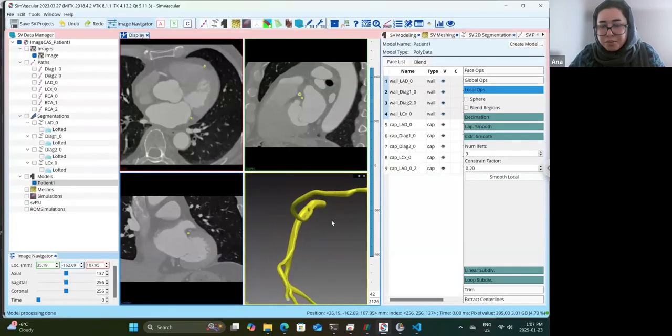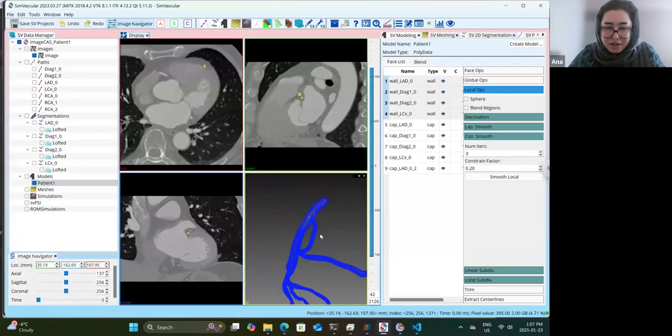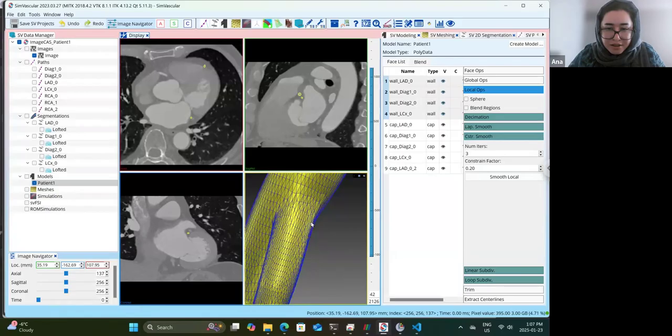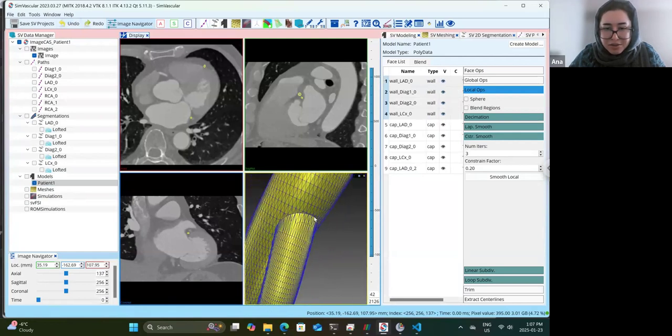And now we need to go back and let's take a look at the edges for the mesh. Let's see what happened to the meshes here. They blended in. And on doing this, let's look at how the mesh changes. So this was how the edges looked before doing the smoothing.